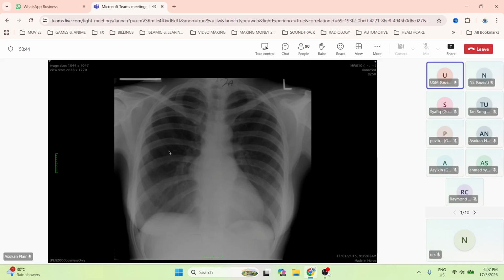Can be tuberculosis. Yes, of course. Tuberculosis with abscesses. Yes. Other than that, it can be a duplication cyst. A duplication cyst you won't get on both sides, right? So what can involve the spine and there's a mass? You think of infection, yes.